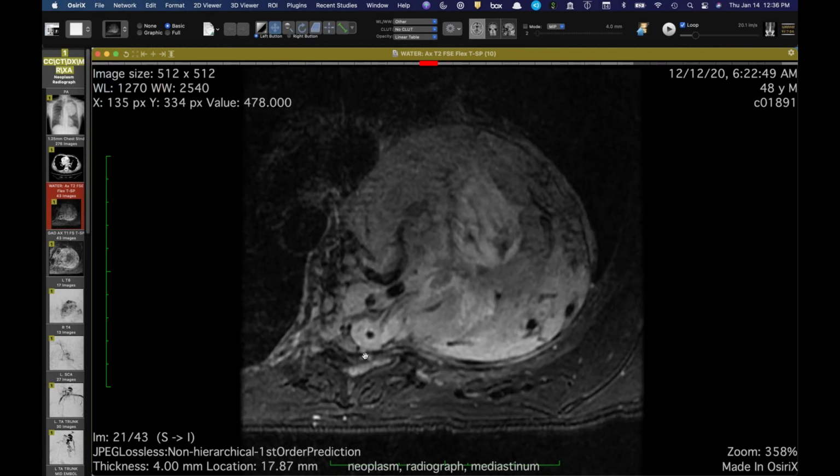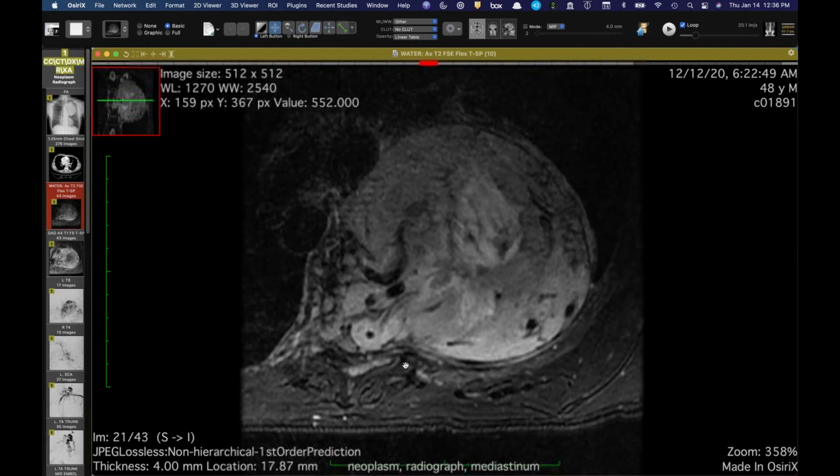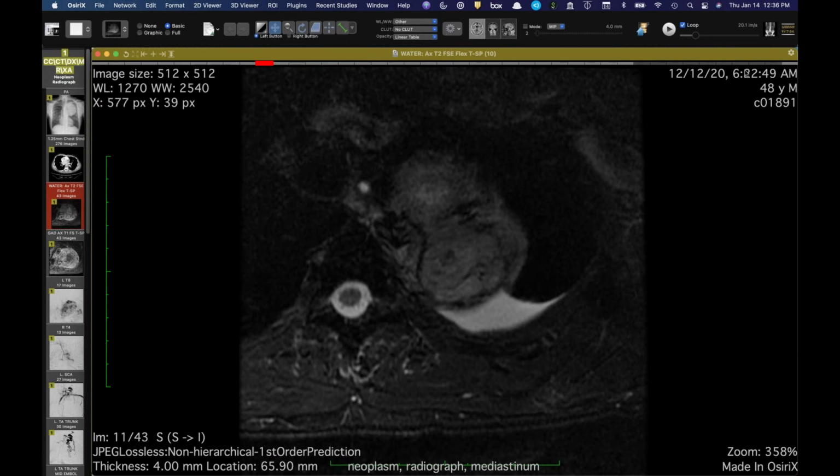And look at the bony destruction. I mean, they're locally invasive. Can he walk? Is he paralyzed? He was not paralyzed. He had weakness, but he was still. I mean, the thing is like in the cord. Yeah, I know. But you can just see how much compression there is of the cord there. The cord's just a little lemon drop in the back there.